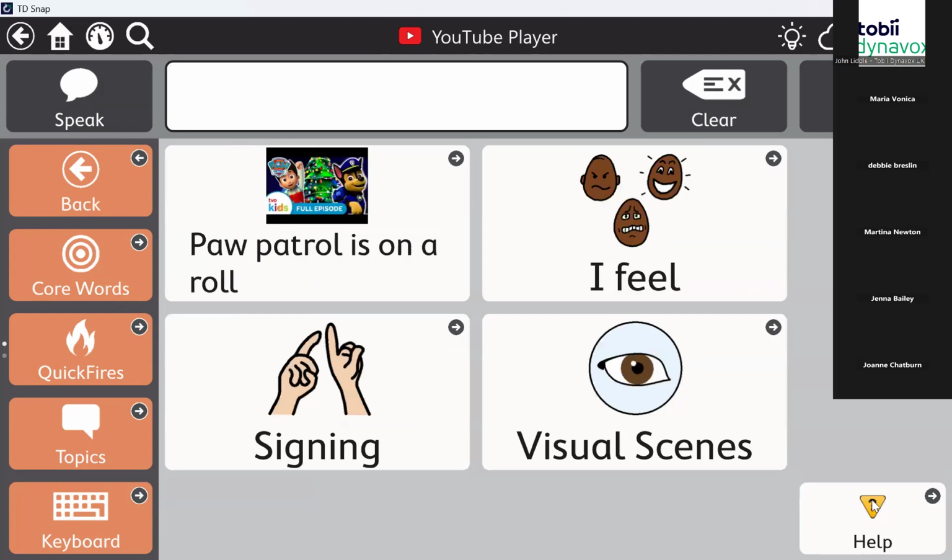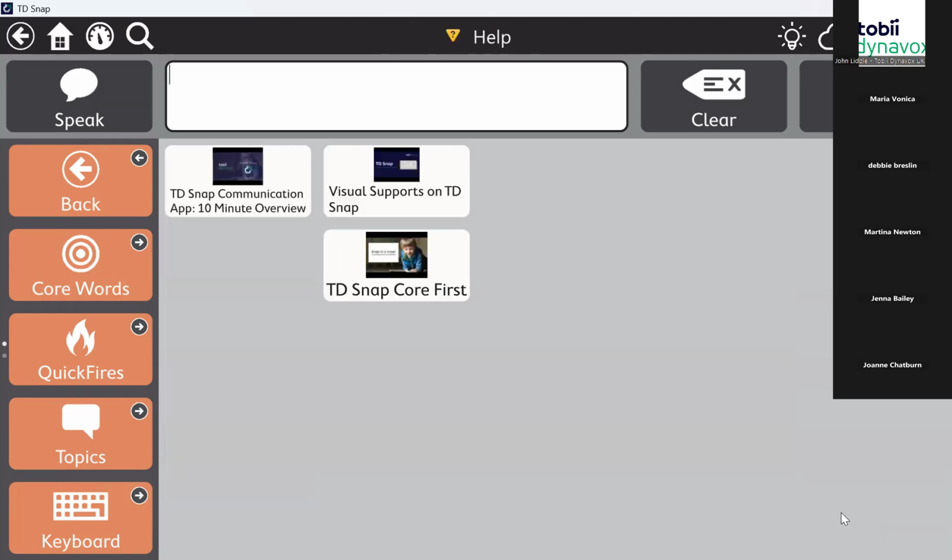So for the help button, I've just made that a little bit smaller, just because that's more for professionals and maybe caregivers at home. So I've clicked on help, and what I've got here are just some links to our YouTube channel on specific TD Snap related questions and things that they might want some more clarification on.